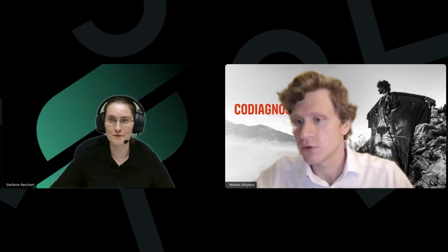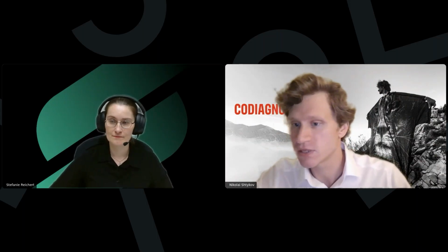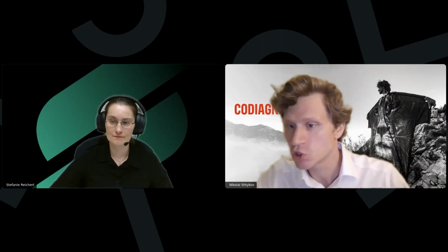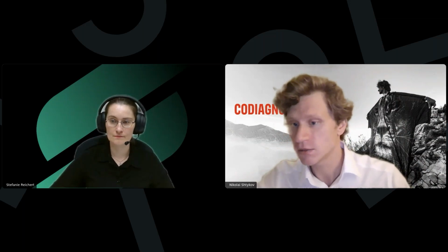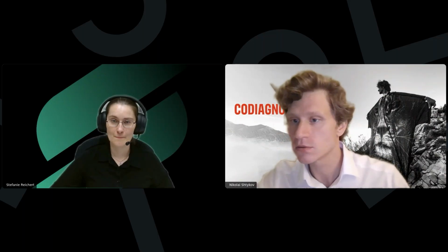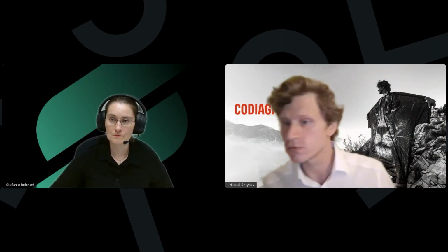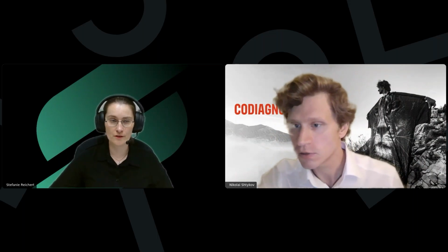If we use angled abutments, how to make holes? Could you show one more? Can you show us how to put the pins? I did it. I think I responded to all of the questions. So could you show more?